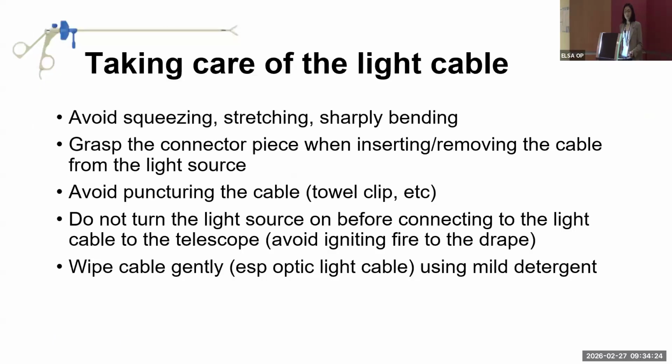Okay, so of course we also have to know how to take care of the light cable. We're the ones using it during the operation. So avoid squeezing, stretching, and sharply bending the cable. And make sure when you grasp the connector piece, you insert it as one piece, so it doesn't break at that end. Also, avoid puncturing it when setting it up with a towel clip.